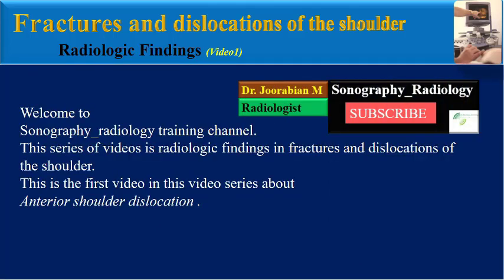This series of videos is radiologic findings in fractures and dislocations of the shoulder. This is the first video in this video series about anterior shoulder dislocation.